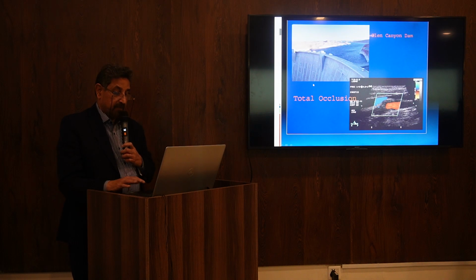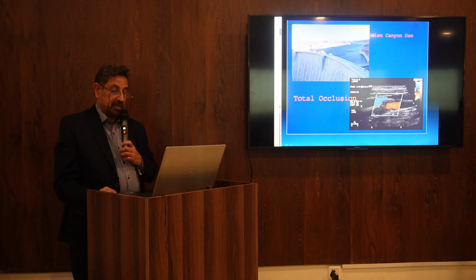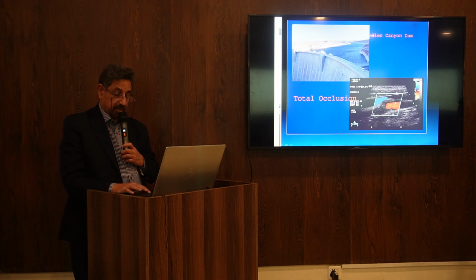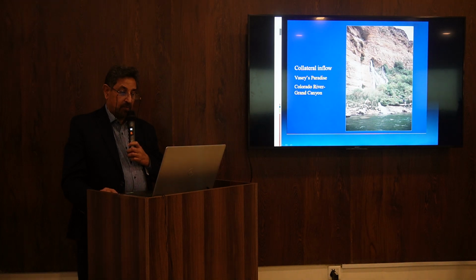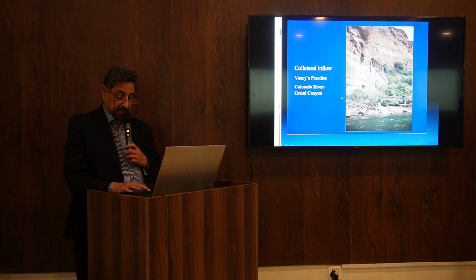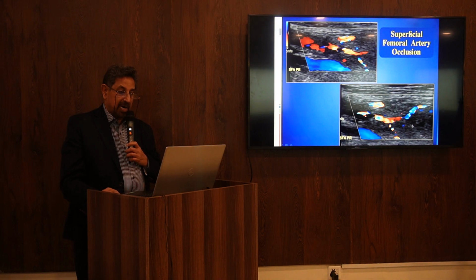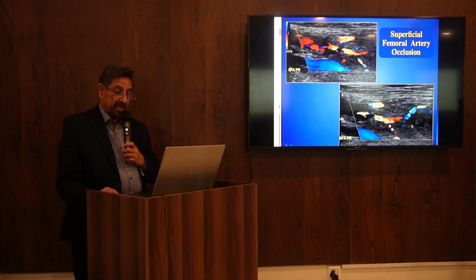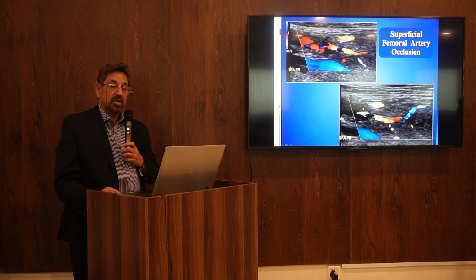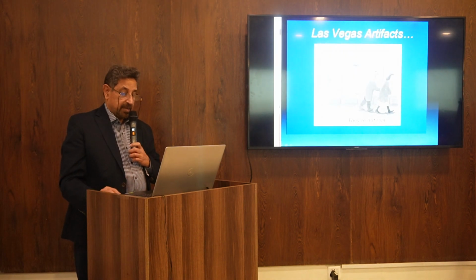that sort of picture. If there's a block, a dam totally blocking the river, so the river will be blocked, then collaterals will open up. The overflow from the other holes in the walls of the river, and you get these. When there is femoral artery occlusion, you get all these collateral vessels, and these collateral vessels will be showing very different spectrum and different colors.